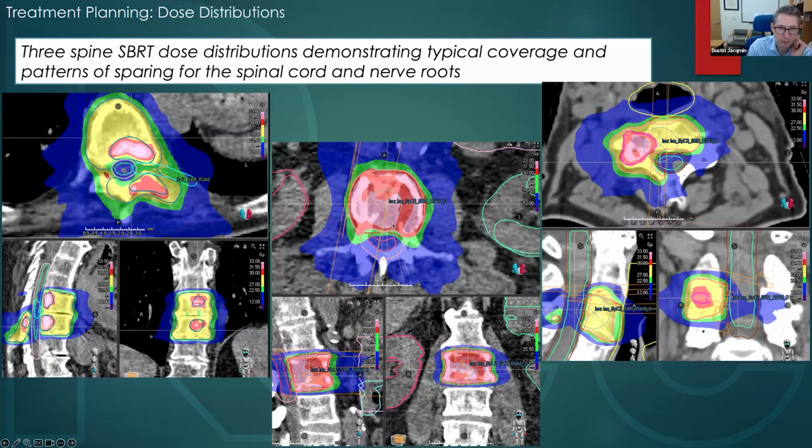the spinal cord. Similarly, here we have our tolerance dose, 25.5 to the cauda equina, and it's touching the cauda equina a little bit, but not quite entering it. And then lastly, here you can again see that our green isodose line is hugging the PRV, and then we're getting as much coverage as possible away. And then up on top here, we're peeling back coverage a little bit to protect the mucosa. So 3 good examples of what a dose distribution is going to look like in terms of trying to find the right balance between organ at risk sparing and coverage for the target volume.